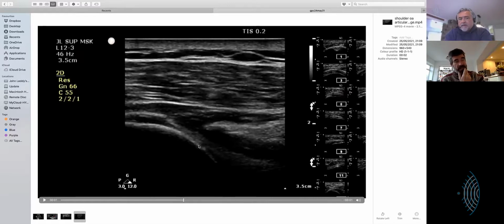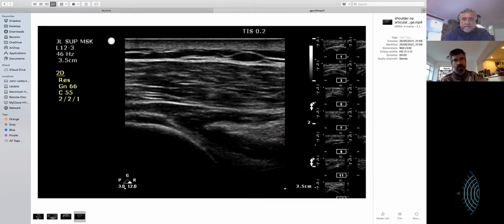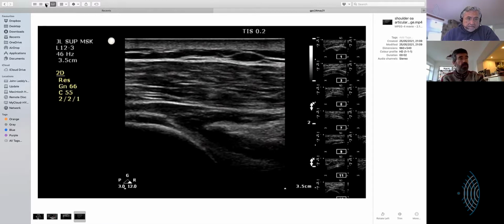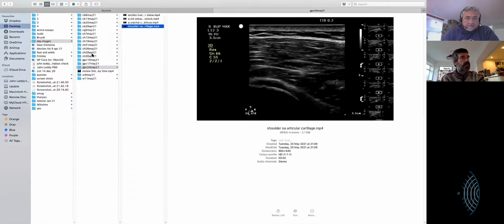Yep, I think this is just cartilage loss. Yeah. More typical. And I've not really seen it there without a huge amount. I can't remember quite what the story was, but it was just a little bit unusual OA. It wasn't a classic OA. This is cartilage damage for whatever reason. So presumably an atypical mechanism.